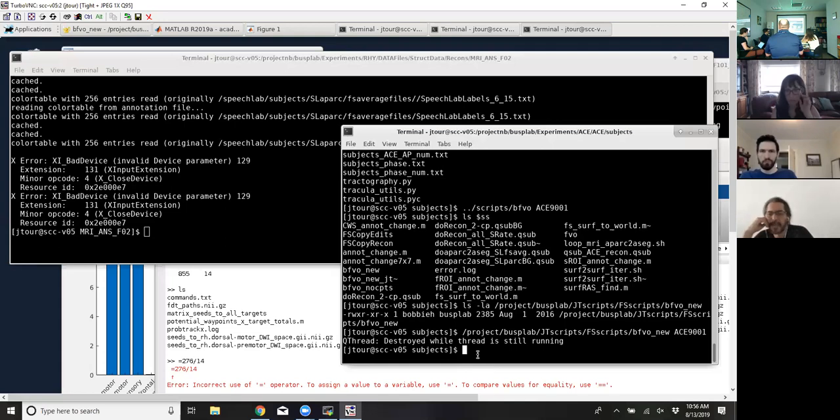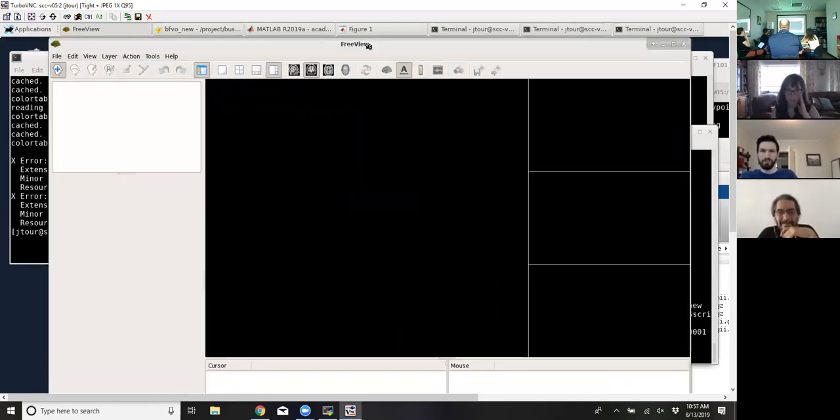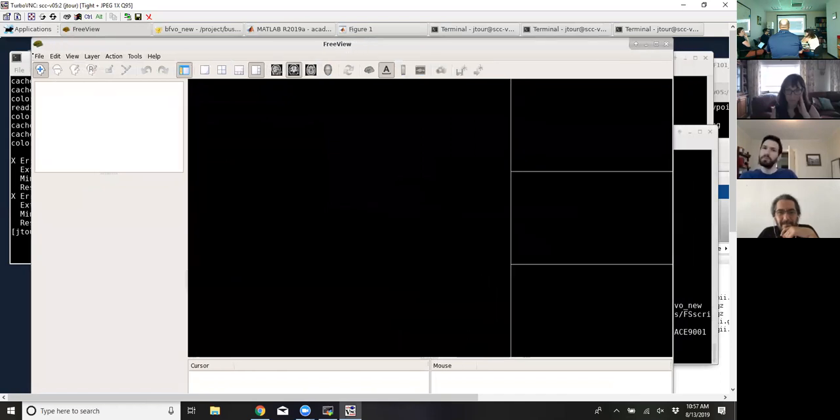Right. It's a tiny detail, and I'll load up Freeview just so we can look at that a bit, and then we'll leave it at that. So I'll load it. I'll do this at Liz's request, but you would never do this. You'll see in practice. Oh, I shouldn't say that. Yeah, no. You would.